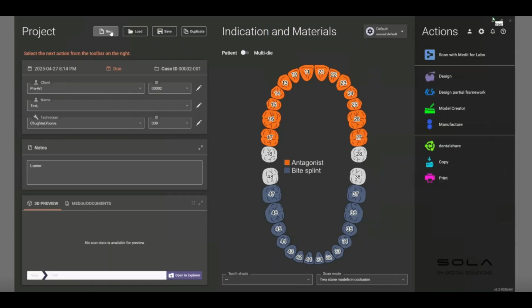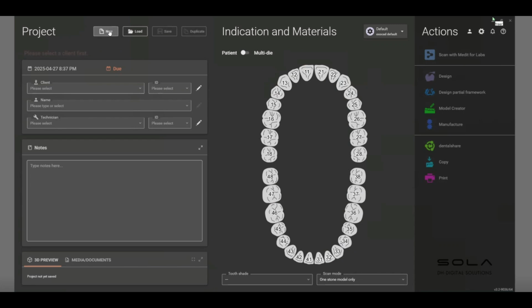Yeah, so we'll just click on new, a new case right there. It's going to give us a new format like this. And then we select whatever the demo. It doesn't really matter. You can put your clients in, you can put your company name, whatever. You can put this over here by using this key.